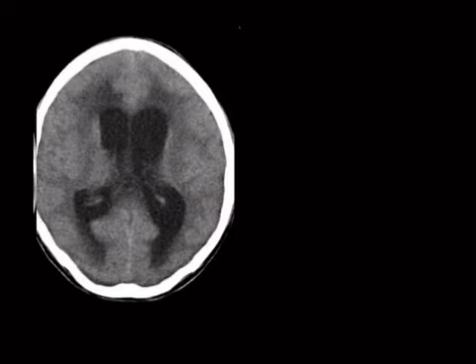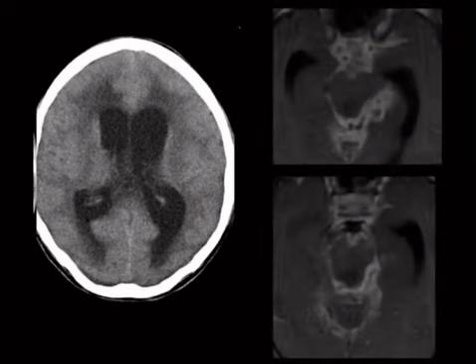And we've got hydro here. I'm showing you hydro. That could be anything, right? And then the next case is this. So this is the skull base, or lower down, not quite the skull base, but basilar. And it's a T1 post-contrast. I'm showing you lots of enhancement, so too much enhancement. So this is our basilar meningitis.